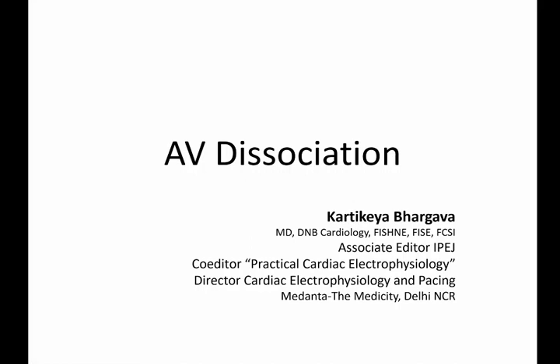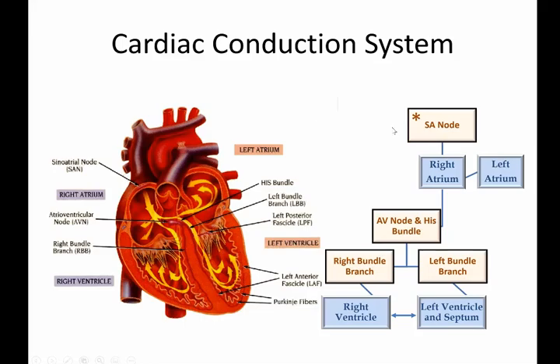So let's see. Today's talk will mostly look at the fundamental concepts related to AV dissociation, and will mostly cover many different ECGs rather than just talk. So let's start with the cardiac conduction system.